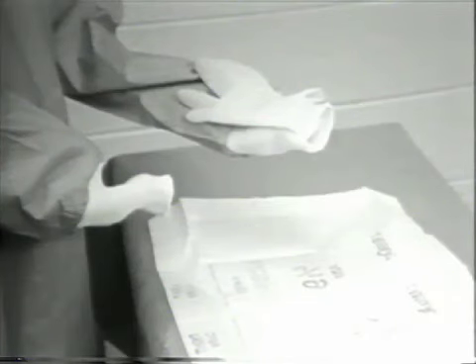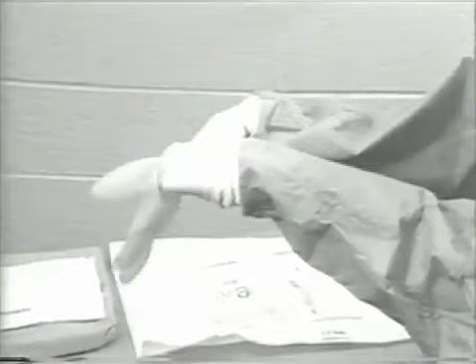How does she get the glove over her hand? She places the glove on her extended palm, thumb down, pulls it over her hand, and pushes her fingers through the cuff openings into the glove.